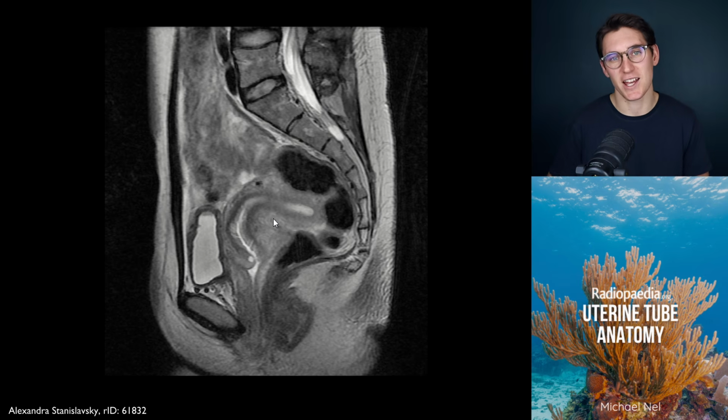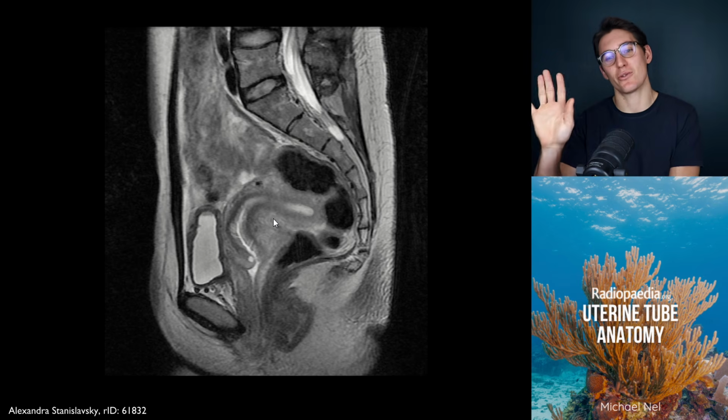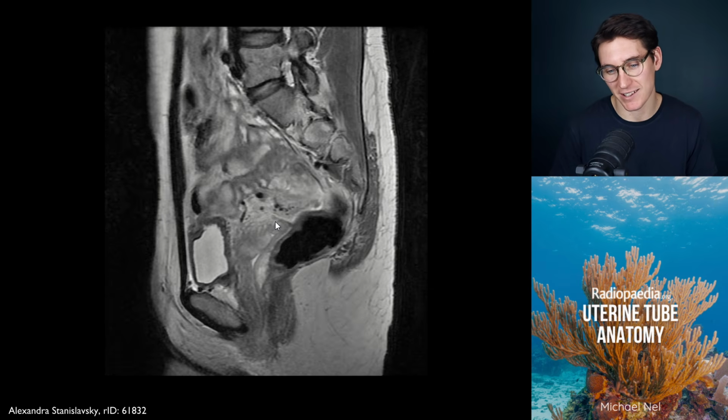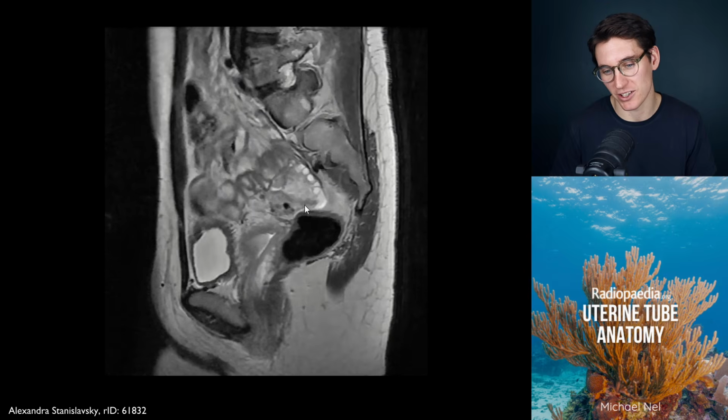And you'll notice that this uterus is retroflexed. It's facing posteriorly. We would expect it to be facing anteriorly, anteflexed over towards the bladder here. So we've got slight anteversion between the vaginal canal and the uterine canal, very slight here, and retroflexion in this uterus. As we scroll out laterally, we should be able to see one of the ovaries come into view.